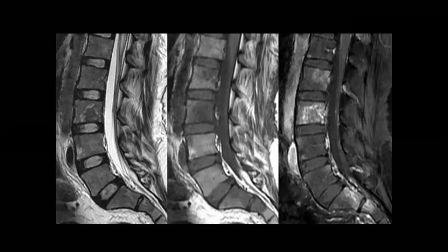That's why MRI with contrast is critical in this case. Spine again, and you find this appearance, especially with the STIR and the high signal in the STIR. So what could it be? Put your differential, please. Yeah, but take care, because in the STIR image it is very high signal.